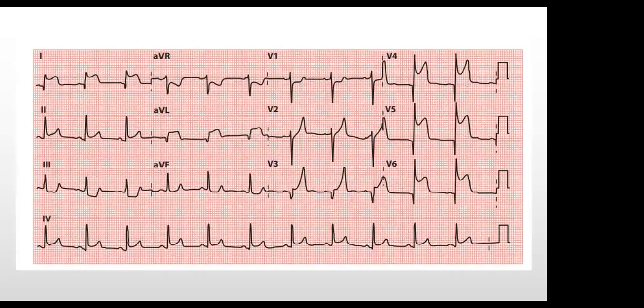All right. So, what do you think? So there's a lateral STEMI, with reciprocal changes in the inferior leads, and also the tall T waves all the way from lead V2 to V6.